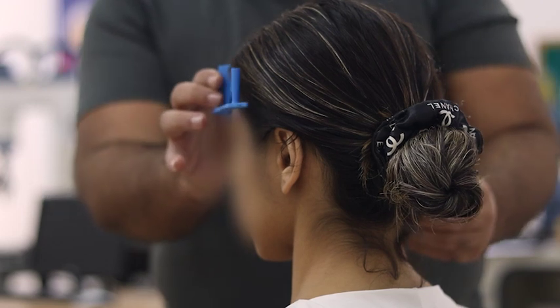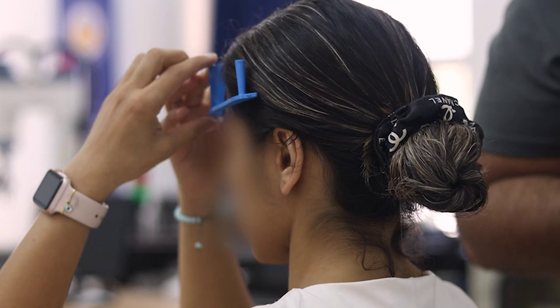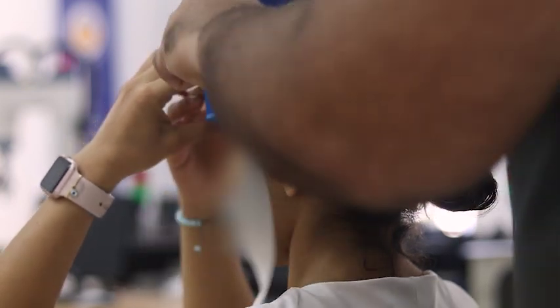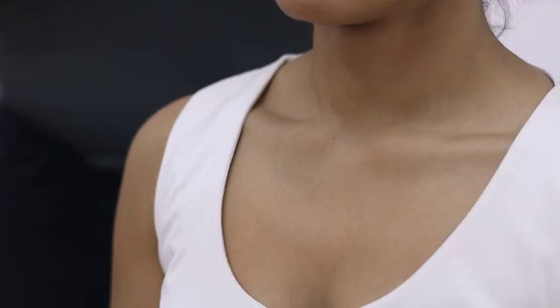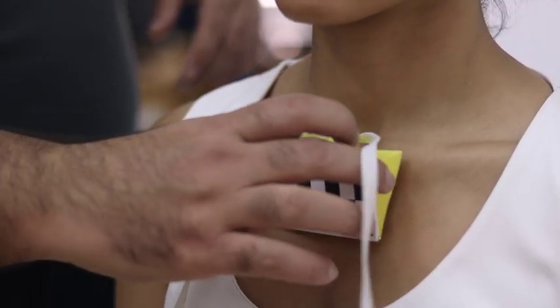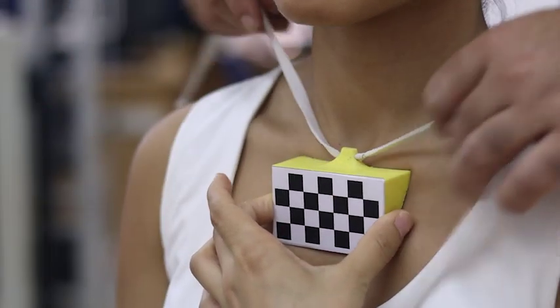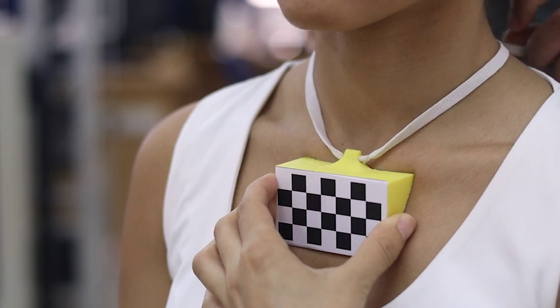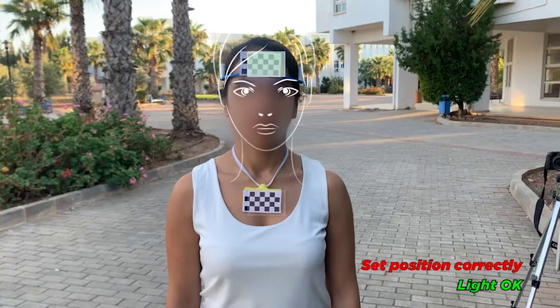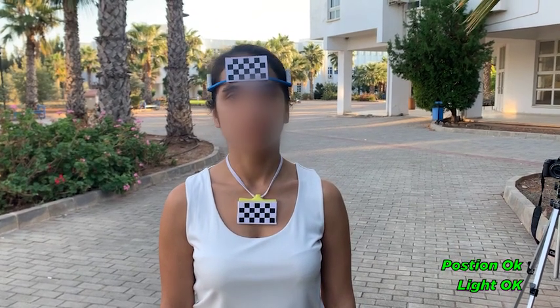When the patients receive the fixtures, with the assistance of a family member, they can wear the marker fixtures and do the action specified by the practitioner while the family member captures the video of the action at the correct distance, orientation, and lighting condition. Some assistive information and graphical guidelines can be provided for the camera operator for a better video recording.